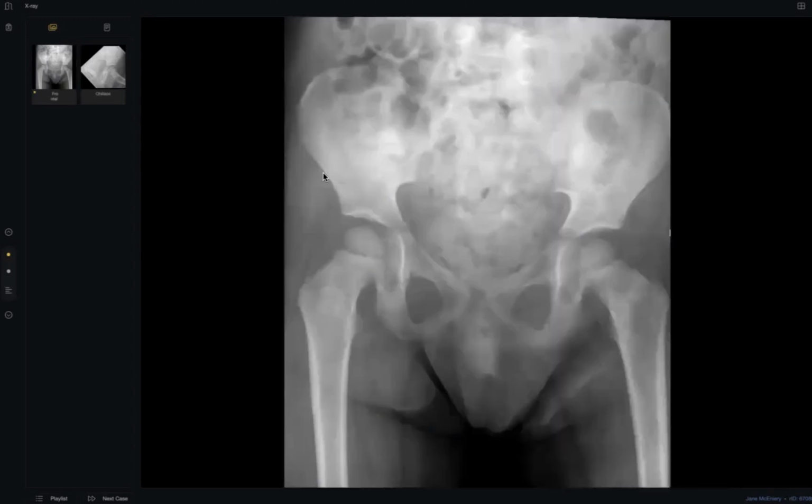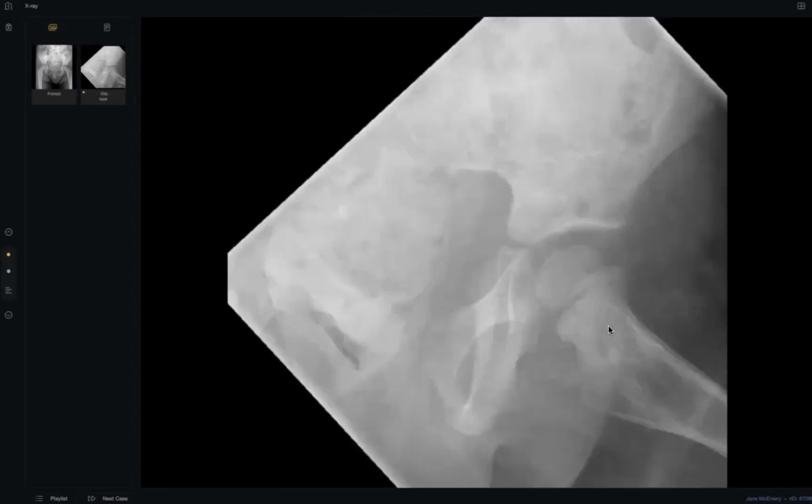Thank you. I will give you one note before we leave it. What does the examiner want from us? He wants you to describe that this is a lucent lesion at the proximal metaphysis or neck of the left femur, ill-defined with a wide zone of transition. Let's see this one, it looks like there is some irregularity in the cortex, and some soft tissue. Doctor, this is aggressive. Three, four sentences maximum and stamp it with your conclusion. This is the most important. Okay, sir.